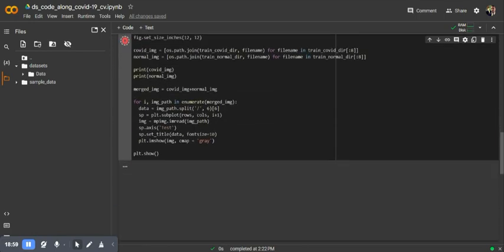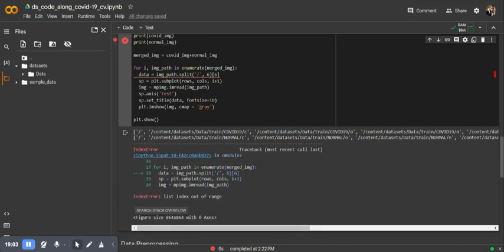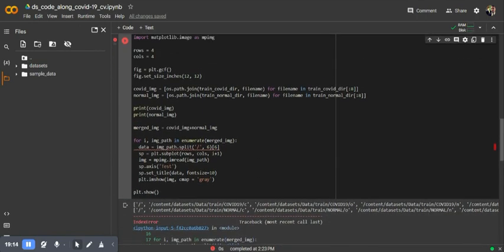So let's hit that again. Oh, what's that? Index list out of range. So is it 6? 1, 2, 3, 4, 5, 6? Yeah, it should be 6. So I know what I've done there. That should be names, not there. There we go.